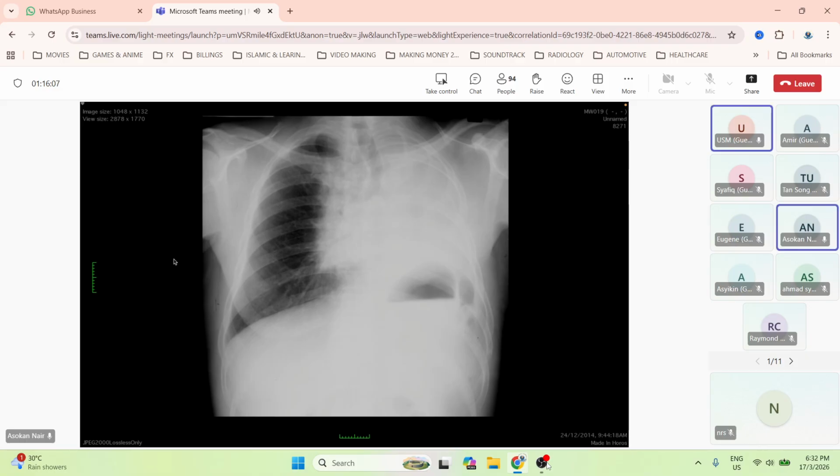So this is actually a patient who had a left pneumonectomy with post-radiation change in the mediastinum, all right? You may want to think of metastases or lymph nodes or whatever else, but a differential diagnosis you need to consider will be radiation. The way to prove that is either to get a history or compare with a previous chest radiograph to see if there's change or not.